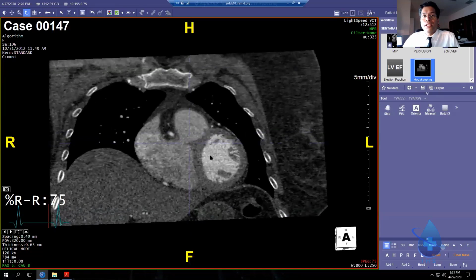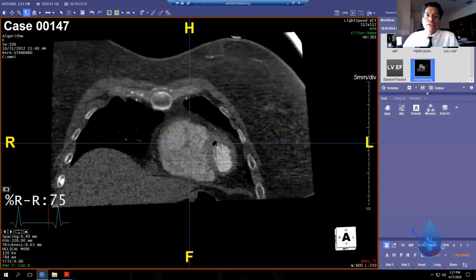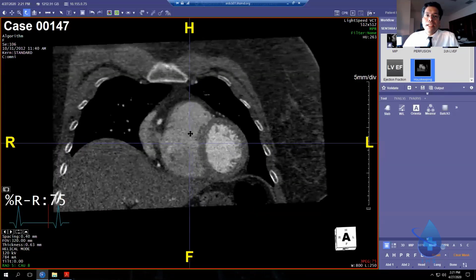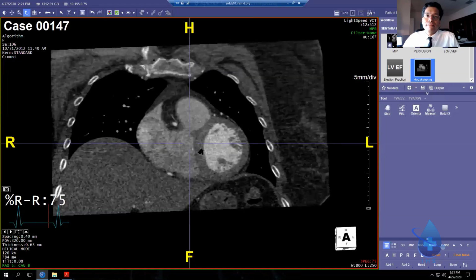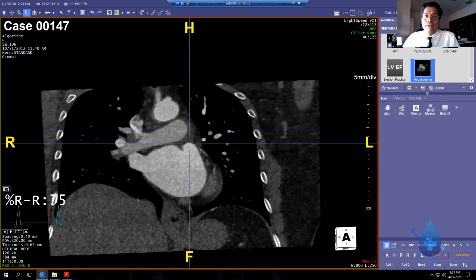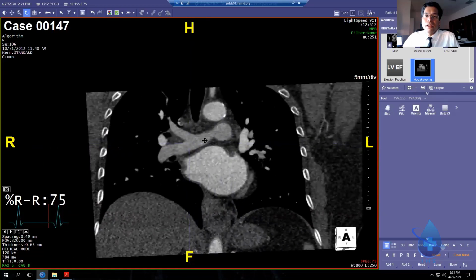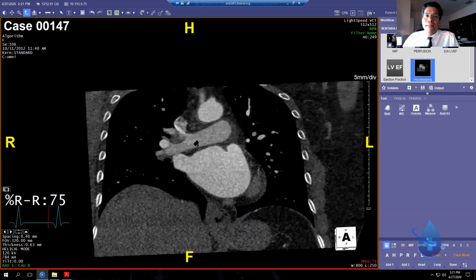What you do is evaluate it in 2 planes. So I cut through the right ventricle, and I look first in the RV for any PE in transit. I don't see any. Then I put the pulmonary artery here, and we cut through the pulmonary arteries, looking for any filling defects. And then as the PA bifurcates, I'll pick one side.